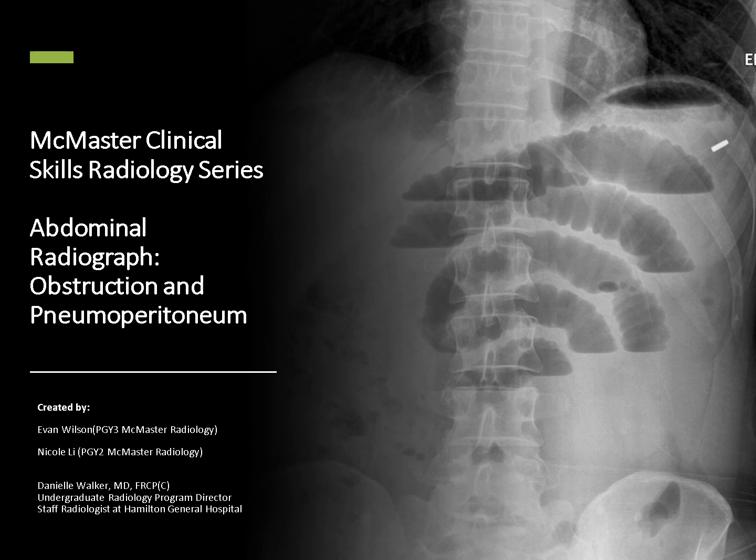So today we'll talk about the abdominal radiograph, specifically obstructions and pneumoperitoneum. And hopefully before watching this video, you had a chance to look at the videos on abdominal radiograph anatomy, as well as the different views that we acquire in an abdominal radiograph. And that will help you understand some of the principles and orient yourself as we go through this talk.